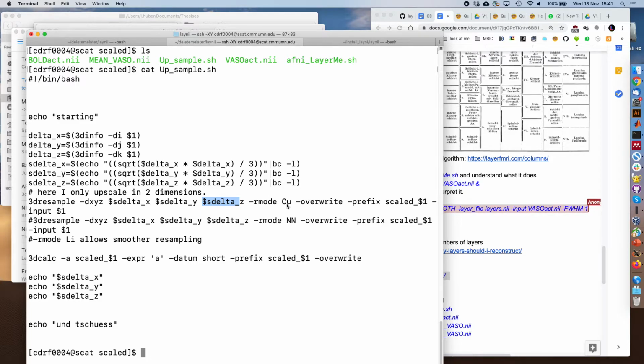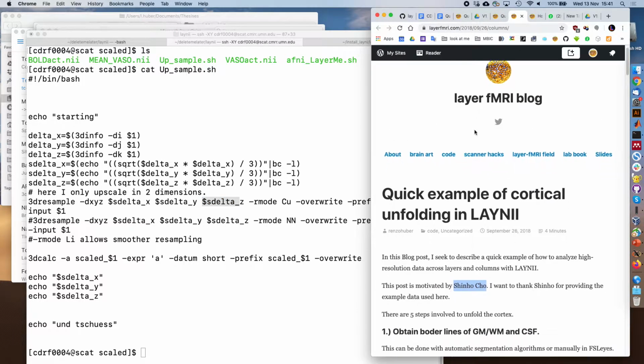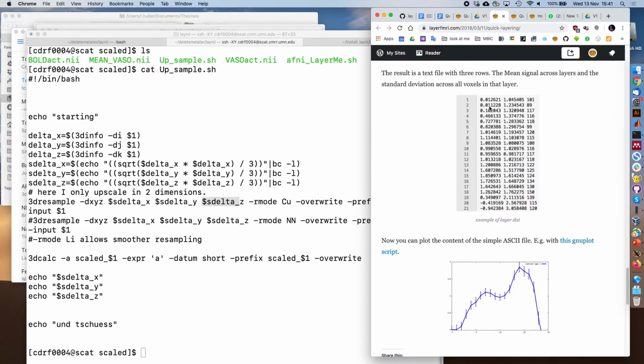I would think we have a signal value that represents the overall weighted average within that voxel. So it's a strong assumption to assume sharp borders of values. I think nearest neighbor is a weird way of doing upsampling. And based on comments from Tim earlier, I might want to show you one thing.